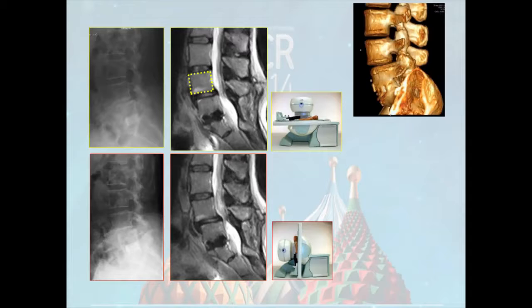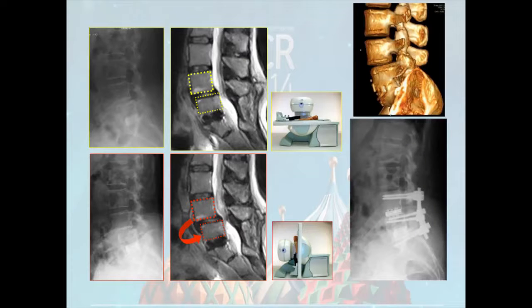This patient was operated with a cage in L5S1, but the symptoms were still present after the surgery. And if you look here, you can realize that there is a rotational instability in L4 over L5, and the patient resolved his problem after having a new intervention with a blockage of the three levels, L4, L5, and S1.